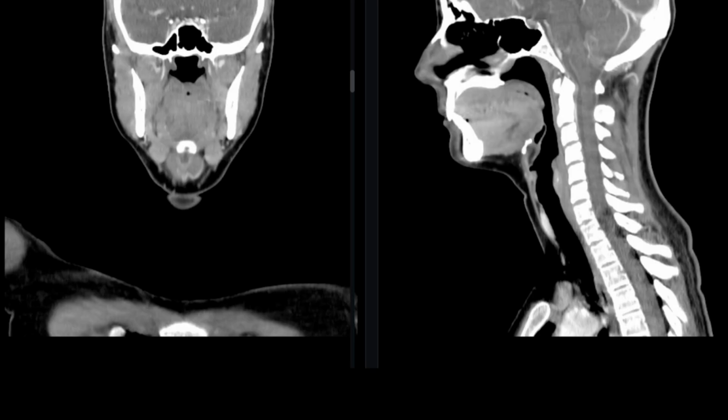In a previous lab, we talked about the thyroid and cricoid cartilage. So for this lab, I'm going to present the larynx from a little bit of a different perspective, just to give you some more exposure to how you may see imaging. This coronal image on the left is showing a slice of the anterior and superficial neck.